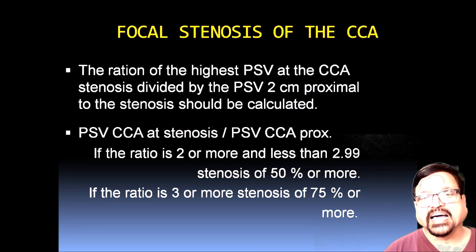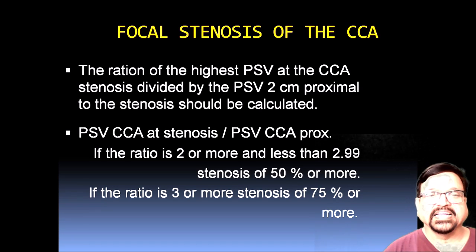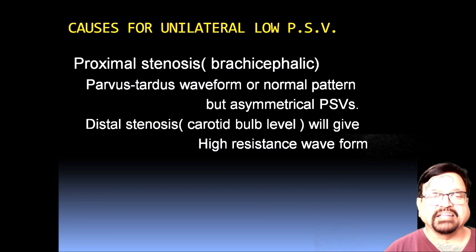Now all these things are required when we are reporting how much stenosis is there in terms of percentage in our report, and therefore they are very important.